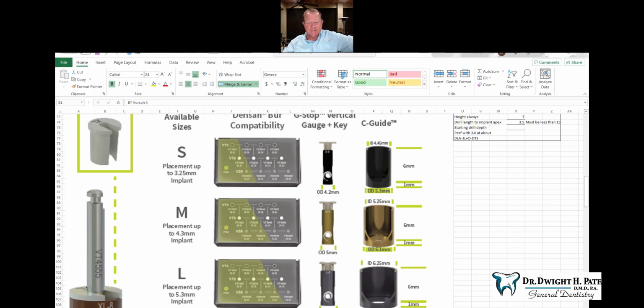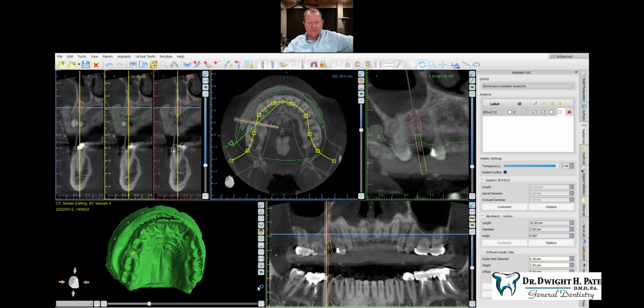So going back to Blue Sky, now we have to look at our offset. All right, we can turn on the sleeve that we're designing, and this is the sleeve that we're designing. You can see that the outer diameter of the wall that will accommodate the sleeve is outlined in this orange box that we want on each side. We're seeing a cross section of that sleeve wall, if you will. The only dimension we have to be concerned with is this inner line right here.